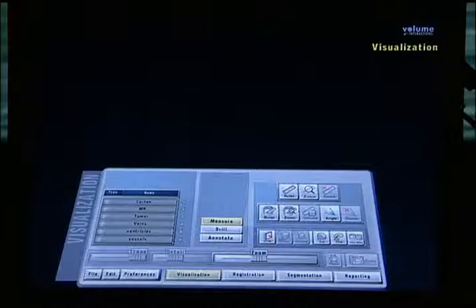As well, I wanted to demonstrate how the type of imaging that we routinely do when we do a navigated approach to a tumor can be incorporated into this system, so that you can actually see a lot more with this system than you could see otherwise. So I'll just present the case, and then we can go through it from the beginning.